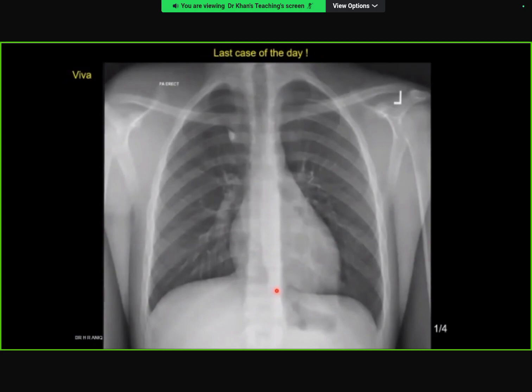So I'm looking at the remainder of the lungs. There's no consolidation or collapse. Incidental note of an azygos fissure. So I'm reviewing the bones. I can't see any abnormality in the clavicles or the proximal humeri bilaterally. The glenohumeral joints appear to be preserved.